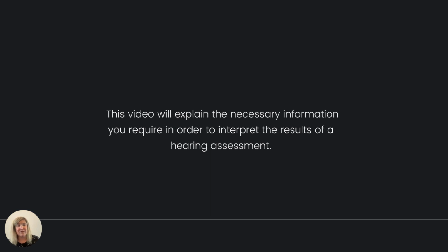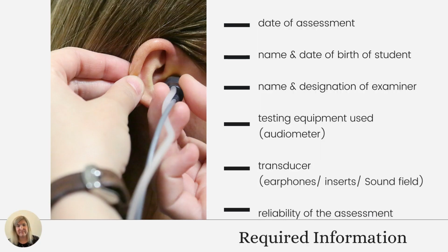This video will explain the necessary information that you require in order to understand the various tests performed during a hearing assessment. There are certain pieces of information that are required for a hearing test to be considered valid.